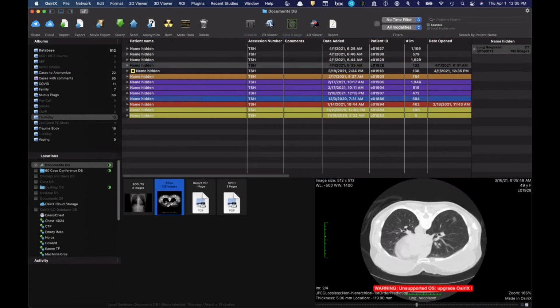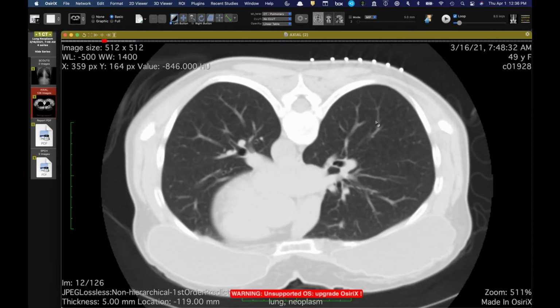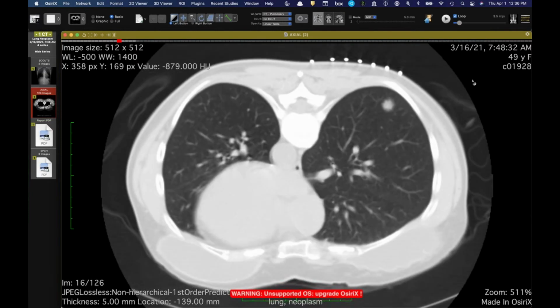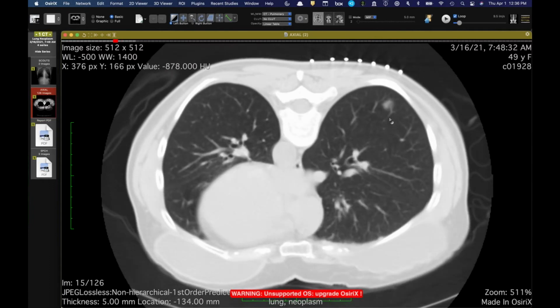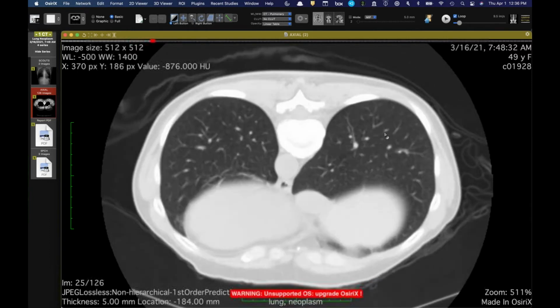Now this is something that my pathologist just brought to our attention yesterday, which I had never seen or really heard of before. All I have is the biopsy CT, unfortunately, but this lady has this subsolid nodule in the right lower lobe that's just over 1 centimeter. And Kirk often gets these outside consults on pathology cases. So he had this biopsy CT available for us.